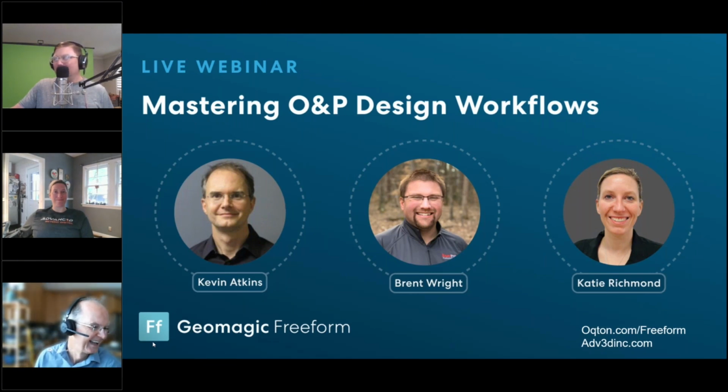Yeah, a majorly X rotation by 90. Okay. Topology optimization, finite element analysis program. Do you use? So you can't do that in Freeform, at least that I know of. Nope. So what I will say, kind of to Kevin's part, your mileage may vary, which also means this is not a medical, all those things that he said at the very beginning for his people.